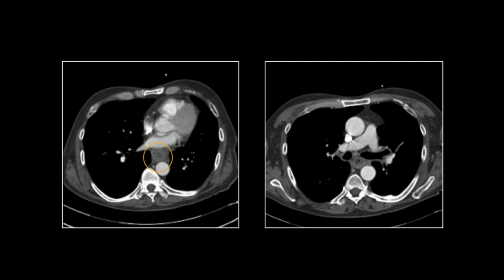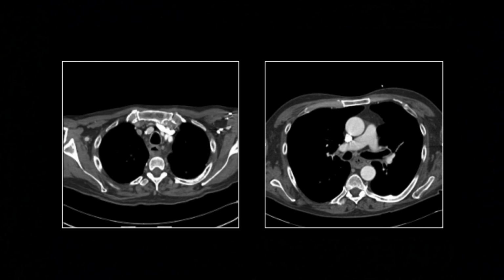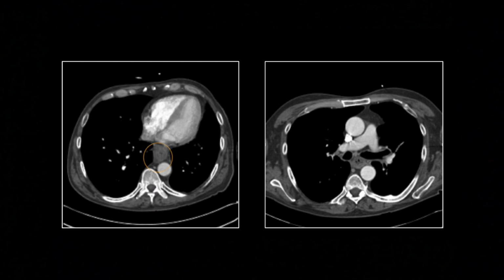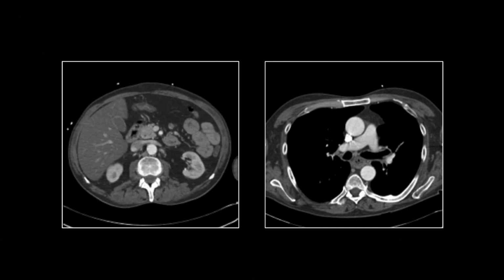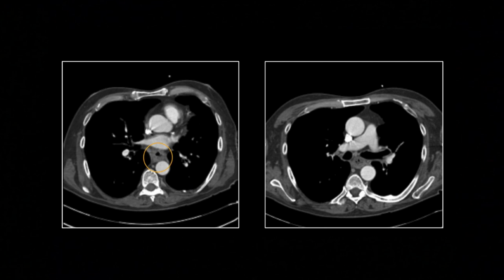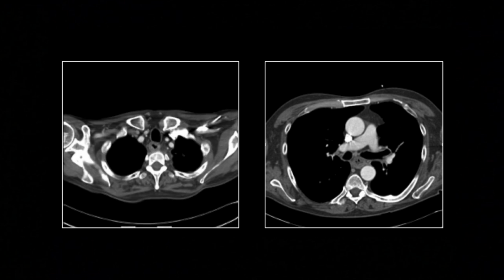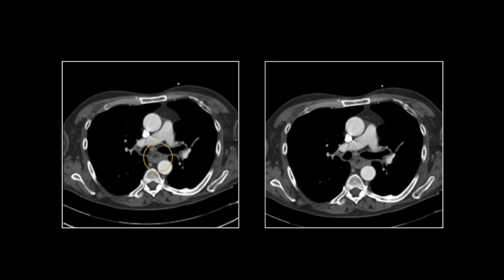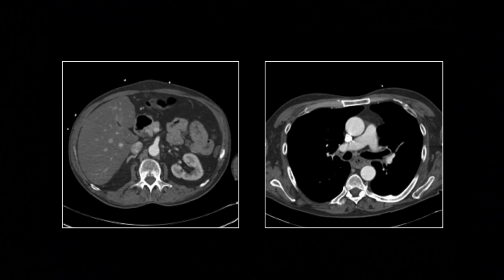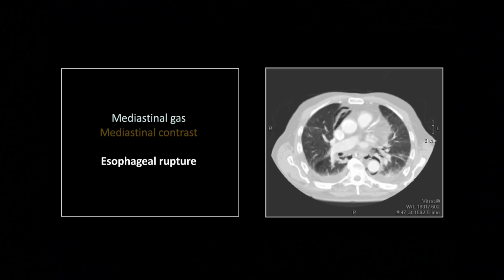If I see confluent involvement of the entire esophagus with an apparent infectious or inflammatory wall thickening, I do start thinking of Candida. Other things that will cause this, other infectious causes of esophagitis, reflux esophagitis, caustic ingestion, etc., all these sorts of things will tend to be more focal or segmental. It's pretty rare that you get involvement of the entire esophagus. So my rules are entire esophagus, think Candida. And similarly, if you see the entire colon involved with an infectious or inflammatory process, think pseudomembranous colitis, and we'll get to a few cases of that coming up.